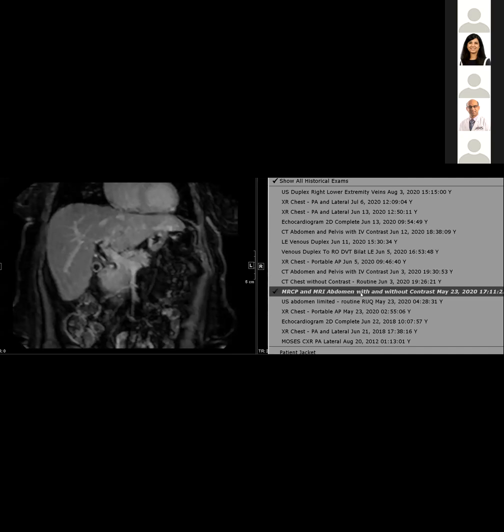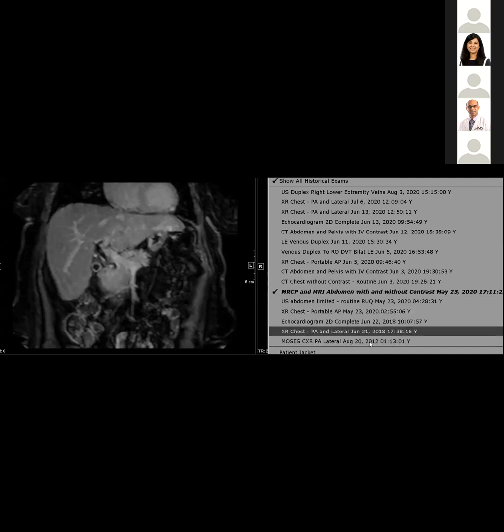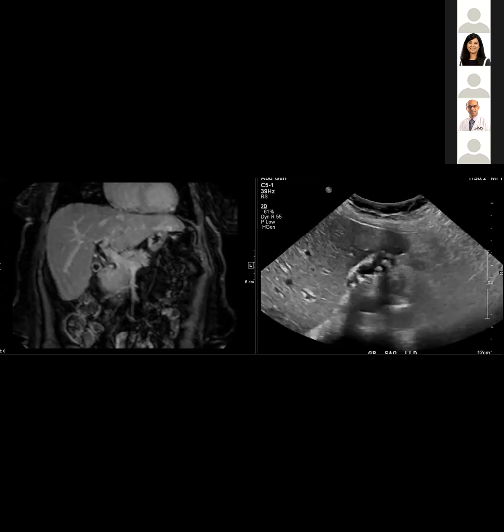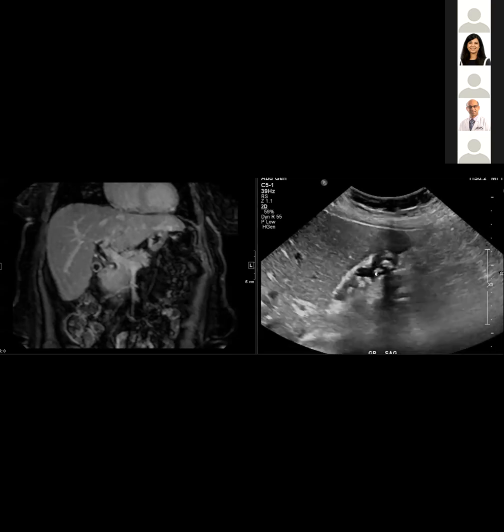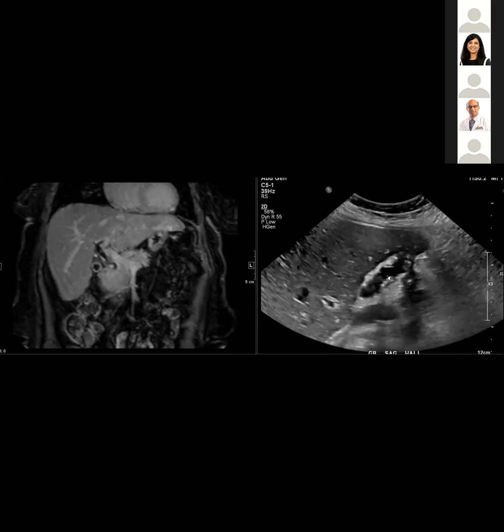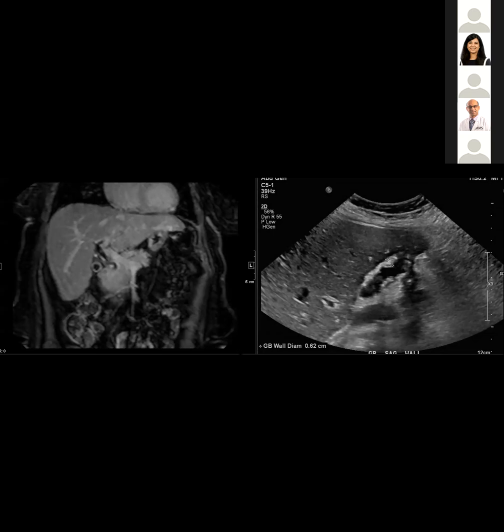We have a CT. Oh, was that after? Let's see. Yeah, no, that was after. Now they're asking David, who is a far greater ultrasound expert than I am. Would you call this a calcified wall, David? No, and really for adenomyomatosis, you want to see the comet tails.